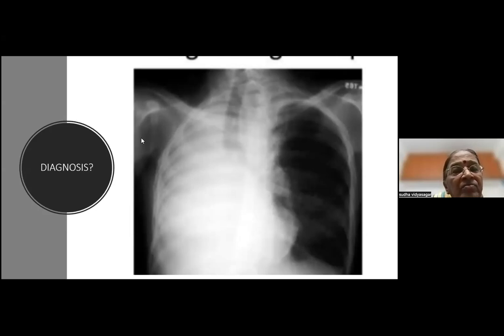Okay. Overexposed. Pleural effusion. Tension pneumothorax. Effusion right. Left pneumothorax. How can we be so divided in our opinions? Okay, right. Pleural effusion. Left pneumothorax. Mediastinal. Left side rib fracture. Where is that now? Okay, fine. So you're calling this a pneumothorax. If this is a pneumothorax, what is this?